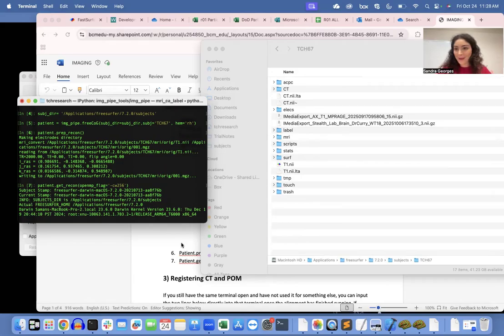We're definitely not going to wait for it on this Zoom call, but we will check back in the next step and make sure that everything that we need is in the right place, and then go ahead and POM register. So that is it. I hope that was helpful, and I will see you for part 2.